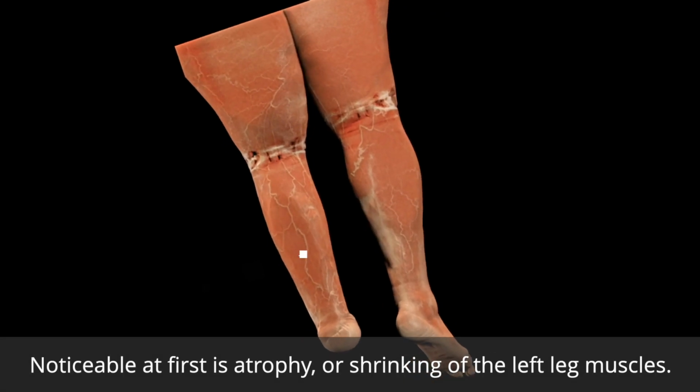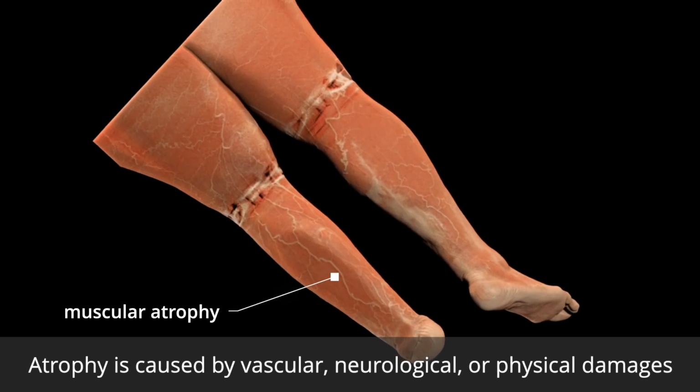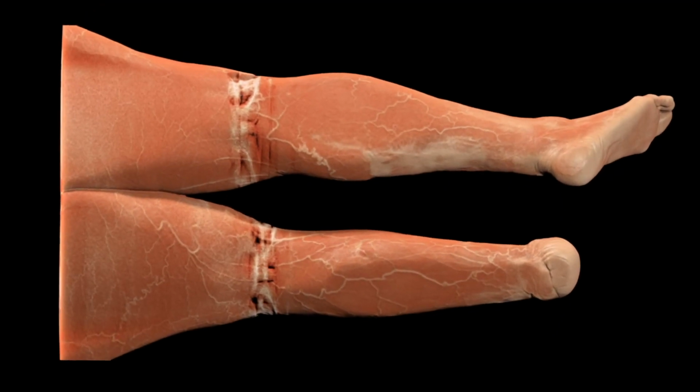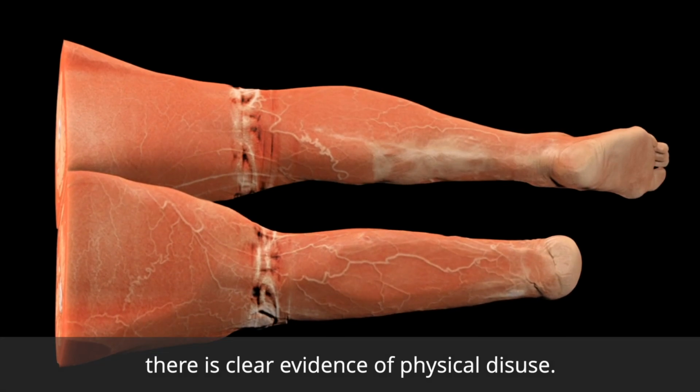Noticeable at first is atrophy, or shrinking of the left leg muscles. Atrophy is caused by vascular, neurological, or physical damages limiting the functionality of the muscles. Because the left foot is missing, there is clear evidence of physical disuse.